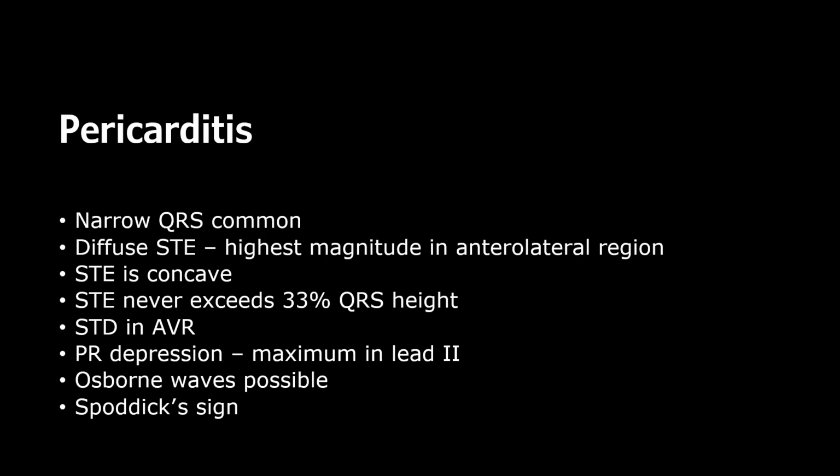All right, let's change pace a little bit. Let's talk about some that are narrow, that have ST elevation in it, but end up also not being a STEMI. Pericarditis is one of the famous mimickers. This is typically a viral infection of the pericardium, and typically presents with diffuse ST elevation.